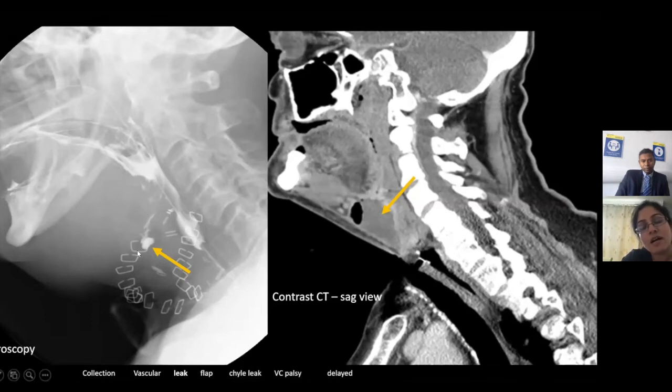So when the patient was asked to take a couple of dry swallows to see if it cleared, it did not clear. It remained as a residual pool of contrast. Now, this is the area where you've stapled the tongue base, and there is a little bit of tension to the sutures. And I am told that that is where there is a redundant mucosa as well.